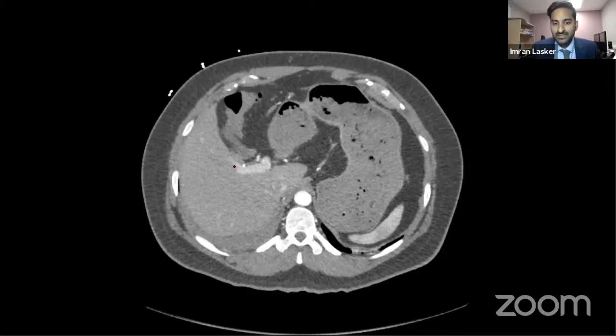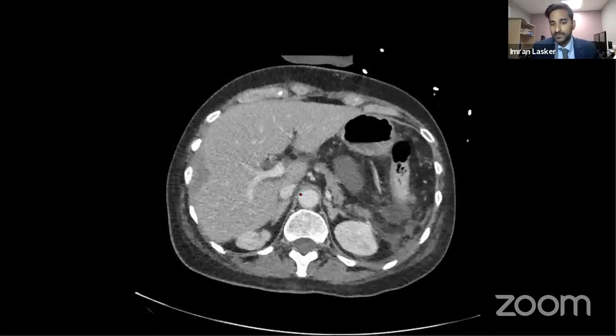But notice the region of the liver. That's a portal vein, and this is definitely denser than the portal vein. So this has to be an arterial phase image. Now we come to this particular sequence of the same patient, and you can see that this and this are almost identical with one another. Therefore, this is not an arterial image. This is actually a portovenous image.